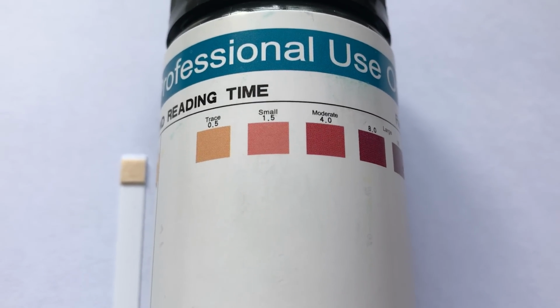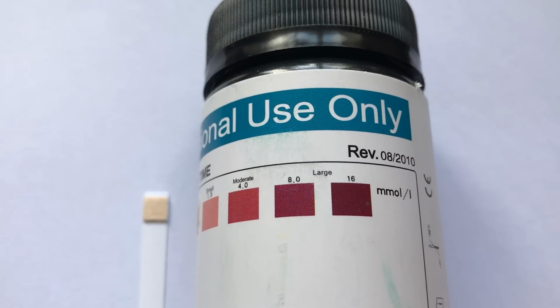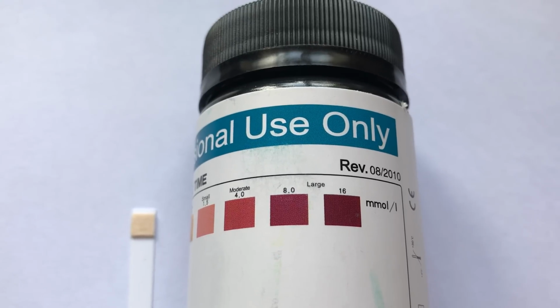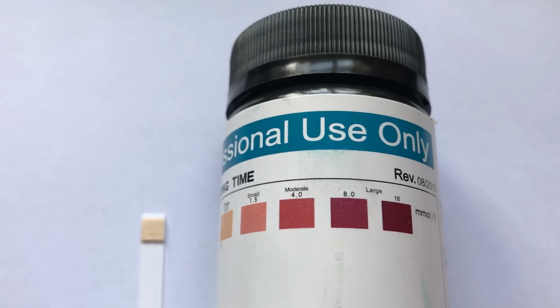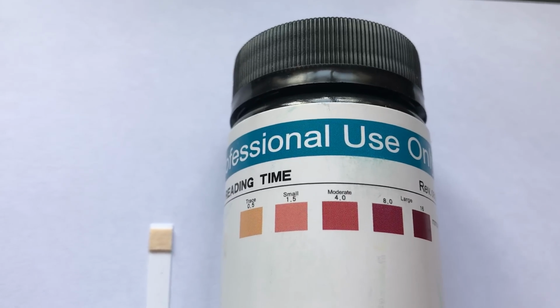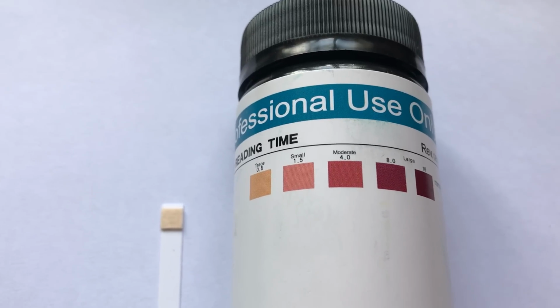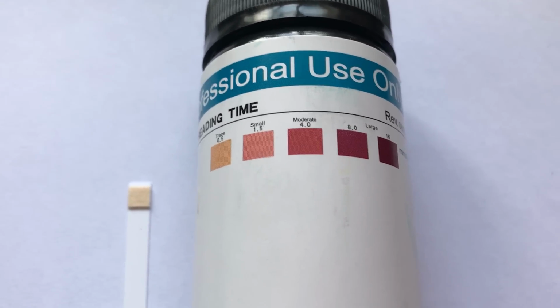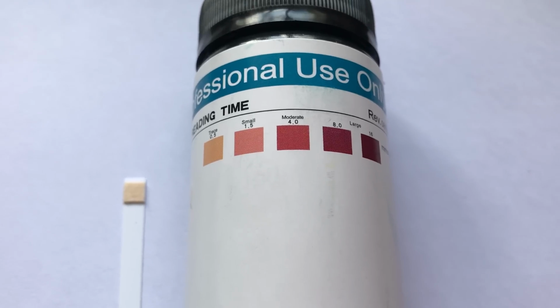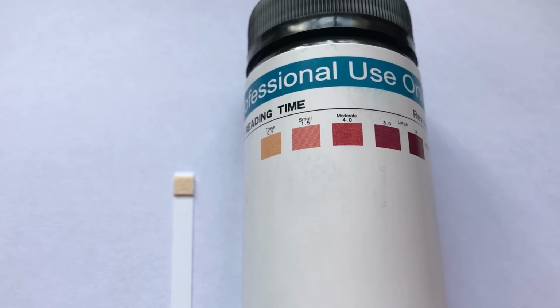So if you are getting over a trace of ketones, either small or moderate, or if you're starting aggressively on a diet and breaking down an awful lot of fats into ketones, then within the first couple of days you would expect to see large amounts of ketones detectable in your urine for the majority of the day. If you suddenly switch to breaking down carbs, if you break your diet and go back onto carbs, there is obviously a lag between what's going on in your blood and what's coming out in your urine, because urine is stored in the bladder. It can be anything up to 8 or 12 hours depending on how much urine you're producing and how dilute it is. But you would expect to see it start reducing over a period of time, and then it can switch off completely and go negative for a period.